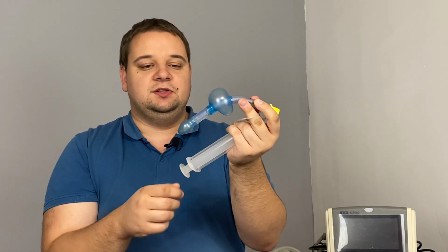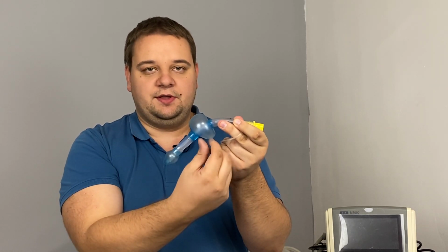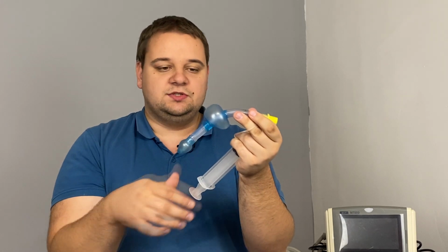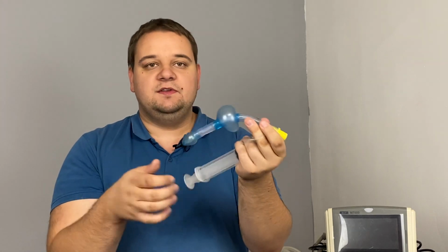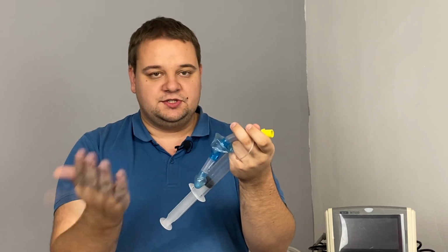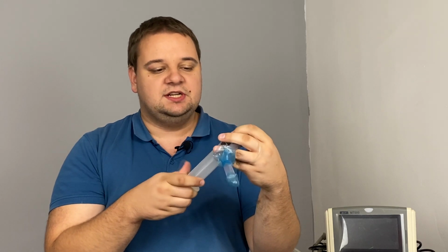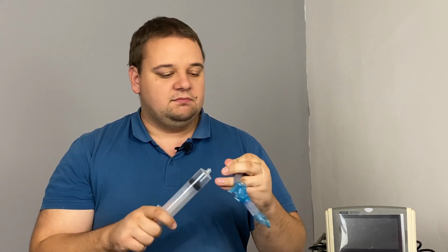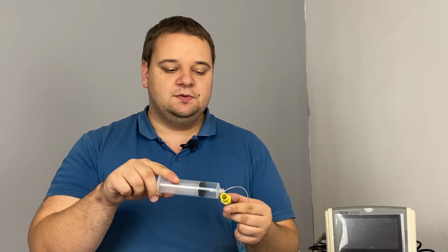And where is that in the patient? So here we have the esophagus, here we have the mouth, and here we have the entrance to the vocal cords. Somewhere here is the epiglottis, and the trachea goes down below. And when you do that, the air has nowhere to go but inside the airway, and you can ventilate patients with this device. The advantage is that we address both the tongue problem and the aspiration problem. The disadvantage is that sometimes it does not seal the airway correctly, and thus there is a risk of aspiration anyway. In some tubes there is an additional port which is used for gastric tubes, so you can wash out the contents of the stomach. This one unfortunately does not have this port.